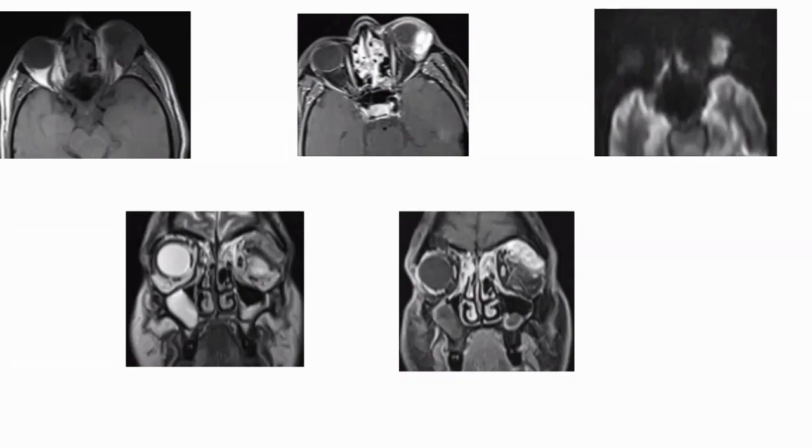Okay, I can see that. There's a mild proptosis of the left eye. There's a little bit of tilt, but still I can appreciate mild proptosis. There is an abnormal signal intensity lesion on the lateral aspect of the globe.